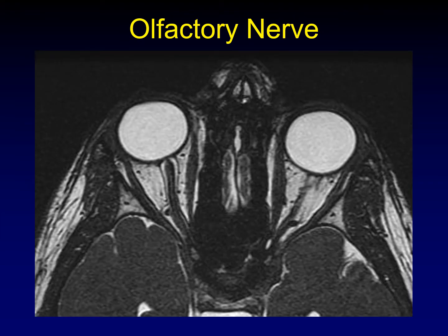In the axial plane, you can see the olfactory nerve on a high-resolution T2-weighted sequence going from medial to lateral. We're in the orbit here. Here's the lamina papyracea. We're coming through ethmoid air cells. We're at the lateral lamella of the cribriform plate. Now we're into the olfactory groove, and there's the olfactory nerve running along the olfactory groove surrounded by CSF. We hit the crista galli and we're on to the other side. So that's the axial anatomy.